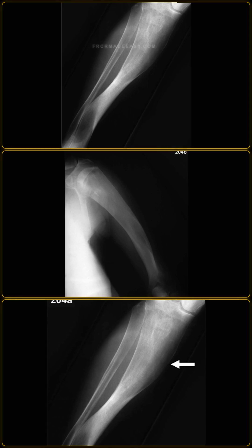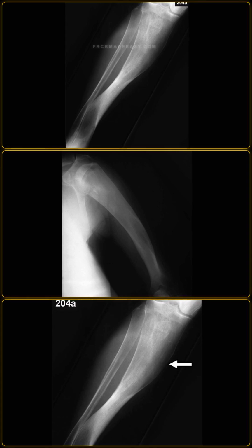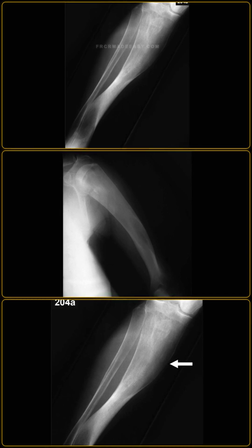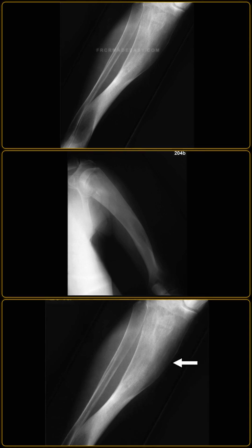Let's delve deeper into the differential diagnosis. How would you differentiate osteopetrosis, lead poisoning, and thalassemia radiologically? When evaluating an Erlenmeyer flask deformity, the presence of diffuse sclerosis and sclerotic vertebral end plates strongly points towards osteopetrosis. If dense metaphyseal bands, known as lead lines, are present, lead poisoning should be suspected. Finally, in thalassemia, chronic marrow expansion leads to a widened medullary space, a classic hair-on-end skull appearance, and generalized osteoporosis.